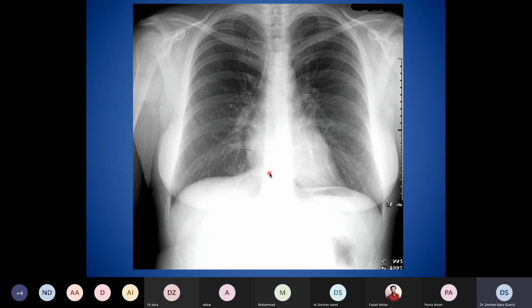It should be barely visible, not truly visible, because if we penetrate too much, the lung markings also become poorly differentiated. But one take home point would be that if we can appreciate the spine behind the heart, it should be a good quality radiograph. It would help to delineate the vascular markings as well over here.